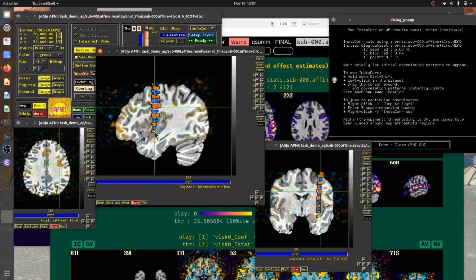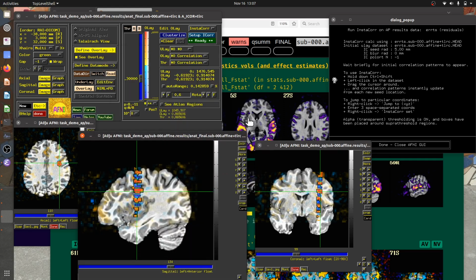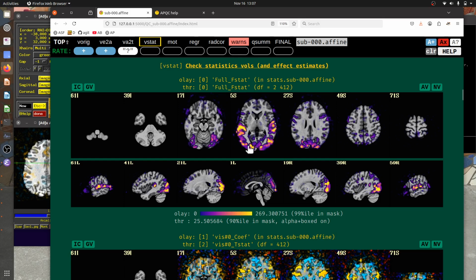This is a question in task-based data. Now, we're not using correlation, we're using regression of this block design to see where significant responses are to our given task. Even so, it's highly problematic to have this strong structural spatial temporal artifact injected into the data. If you look and see where most of our analysis of interest is, it's going to be in the visual and audio regions, because this is an audio-visual task. But there are parts of the brain we're going to be interested in across these networks elsewhere.